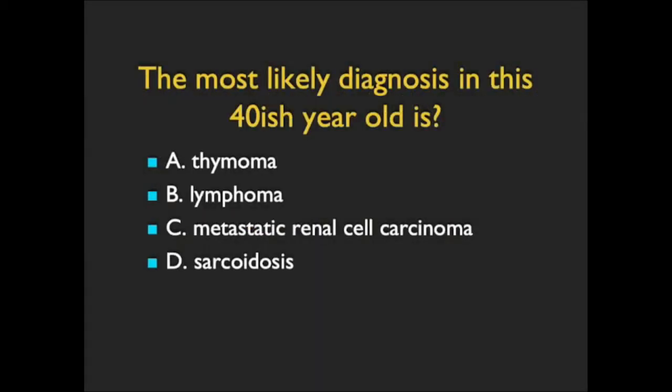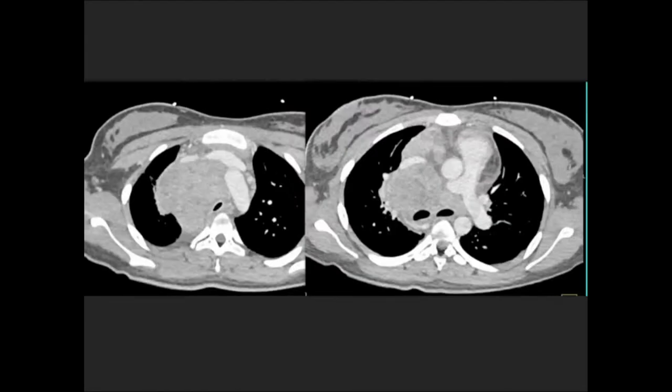Now, in this case, the patient had chest pain. What's the most likely diagnosis? Large paratracheal and mediastinal nodes, middle mediastinum, anterior mediastinum, paratracheal region. This is a classic case of B-cell lymphoma. Large, bulky nodes. The nodes have some vascularity. This is not the appearance of thymoma.